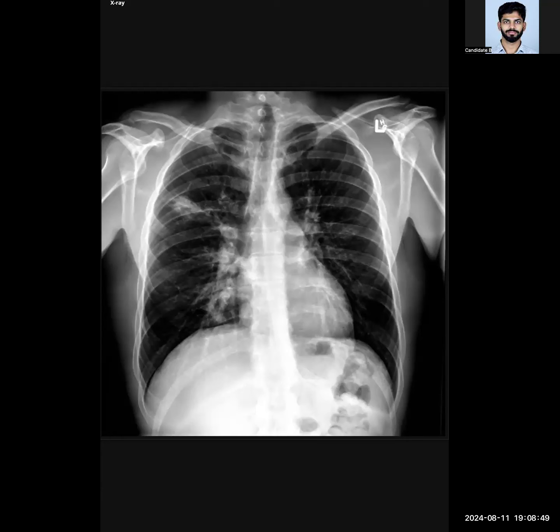Other than that, the lung fields appear hyperexpanded, over expanded. The bilateral costophrenic and cardiophrenic angles and the apices are normal. I'm looking through the bones. The bones appear grossly normal. In my routine practice, I would see it a little magnified, the right middle zone. To see the outlying bone, to see if there is any abnormality. The bone was normal.